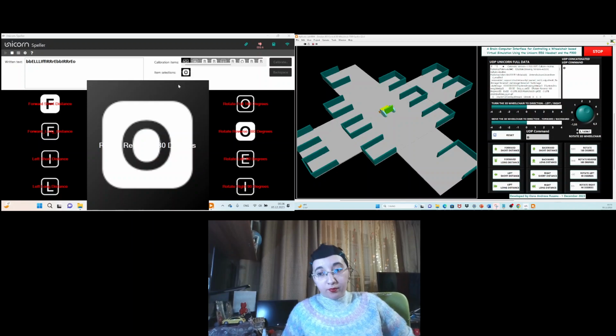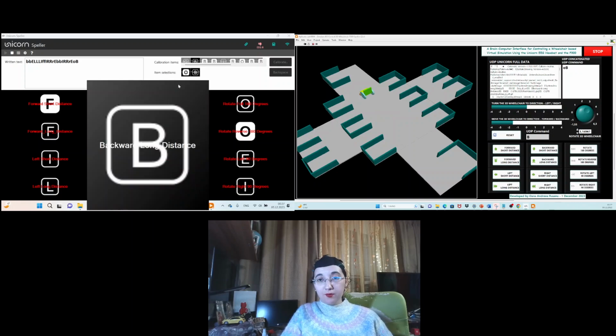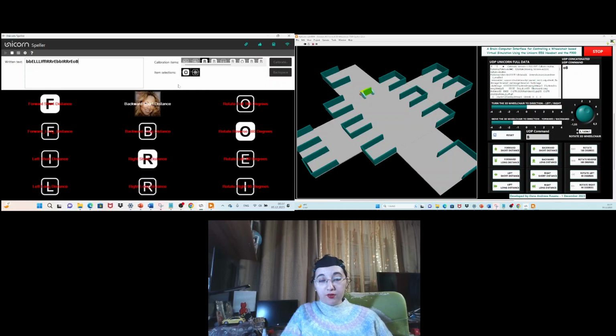Perfect, okay. Backward long distance. Really nice. Backward short distance.